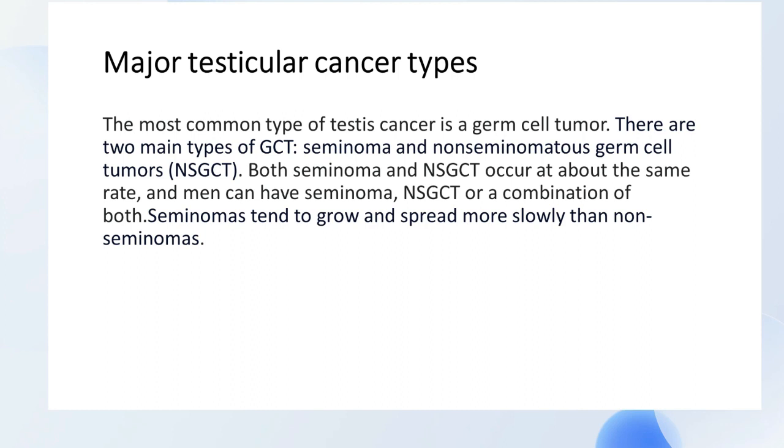But non-seminomatous tumors are rapidly growing lesions, so they can invade the surrounding tissues faster, and they can also send metastases elsewhere. So you can see these are multiple lesions, irregular in outline. But seminomas are slow growing, they can be regular in outline, without metastases, and they are not as aggressive as your non-seminomatous tumors.